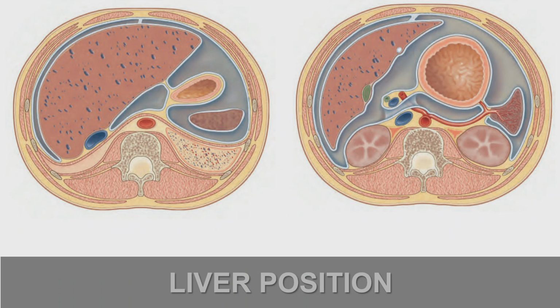So liver position then is seen here on the transversal section. This is the liver, and here liver. The liver is an organ of GIT gland, GIT external gland, which is localized and developed in the so-called ventral mesentery. Ventral mesentery is the attachment of the primitive gastrointestinal tube to the anterior wall, and the rest of this are these two structures.